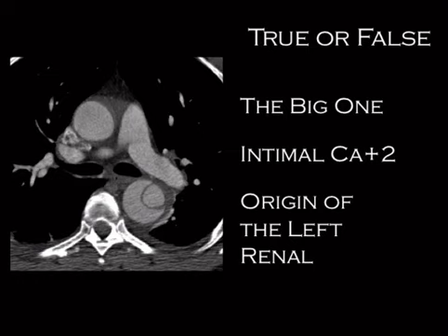So which one's true and which one's false? And what I mean by that is, which one's the true lumen, which one's the false lumen? So here's some general tips on that. The larger of the two is the false lumen. And the way to remember that is that it doesn't have the normal layers that the true lumen would have. So it's more flexible. It's going to distend more easily because it's not the normal coating that the artery has.